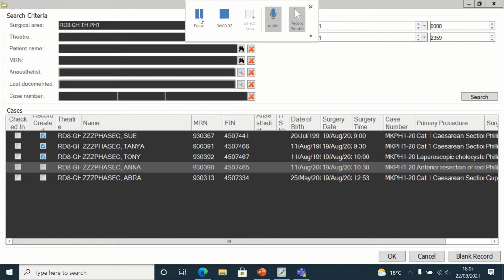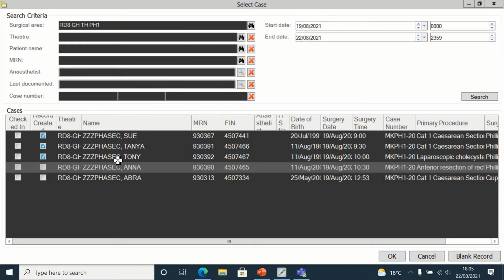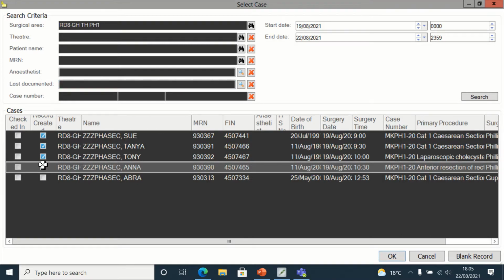Hello again, everyone. This is a video demonstrating the GA major macro. So when you see that, you have to choose the patient here. So the patient is chosen.